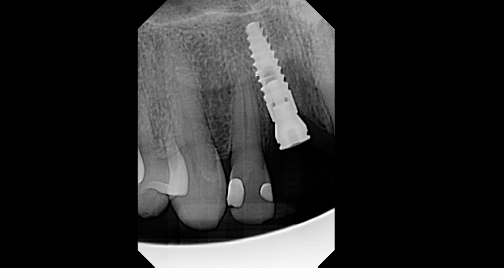So my thought is, why was it placed this way? Could this have been placed more centrally in this edentulous ridge? And I don't know the answer. Unfortunately, we do not have 3D imaging of this area. If we had a cone-beam CT, we would be able to better evaluate the location of this implant in relationship to, what's the word I'm looking for, the nasopalatine canal, or the duct that's located between the two central incisors.